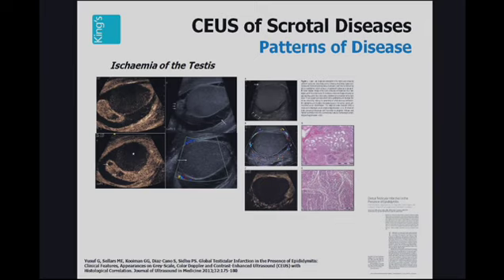The surgeons will remove this testes to alleviate pain, and you are able to give this information to the surgeons, that there is absence of vascularity, to allow this procedure to be performed with confidence. Increased enhancement in the epididymis is clearly demonstrated, and on this view you can see two small abscesses forming in the epididymis. There is absolutely no vascularization of the testes, there is no blood supply, and that testes will not survive. Orchidectomy is the correct management.